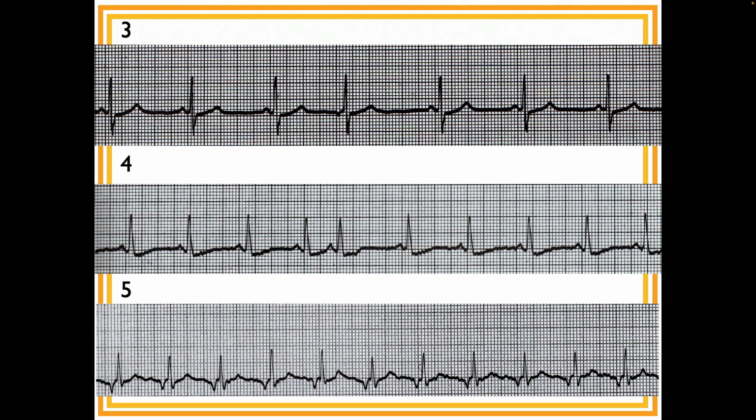Alright, it's all regular. Our R to R is all regular. Heart rate. Oh, 100. Okay, looks like we have inverted P waves. I think, yeah. PRI, good. And QRS is good too.